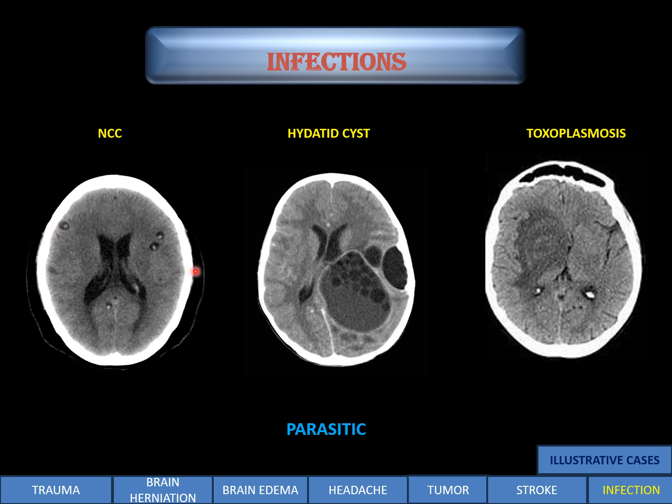NCC: a solid cystic lesion, with tiny, small, soft tissue scolex which are seen within the cyst. So that favors an NCC. Hydatid cyst, in which there is a cystic lesion with a variable hyperdense, marble kind of appearance, which is a hydatid cyst. Toxoplasma, the typical target sign: black, white, black, white, black. This is better picked up in an MRI. So this suggests toxoplasmosis.